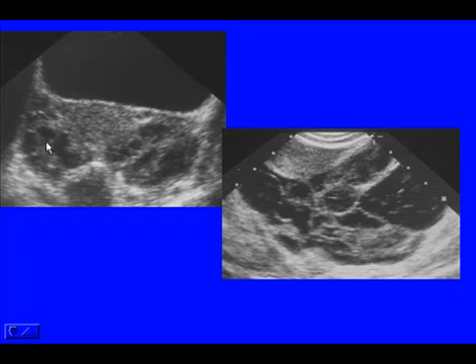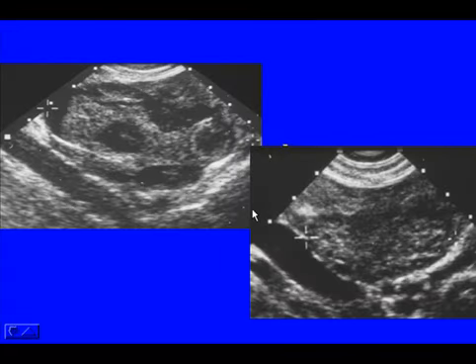And here's another patient, with bilateral disease, which is common in pelvic inflammatory disease. This is a transabdominal transverse view of the uterus and shows bilateral adnexal masses. Transvaginal ultrasound on your right shows that the masses are very complex, multiloculated. In this case, there was nothing to actually drain. This patient was treated with antibiotic therapy, and afterward she returned and her ovaries had resumed the normal size and morphology.